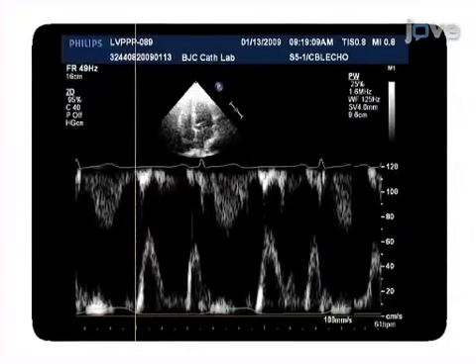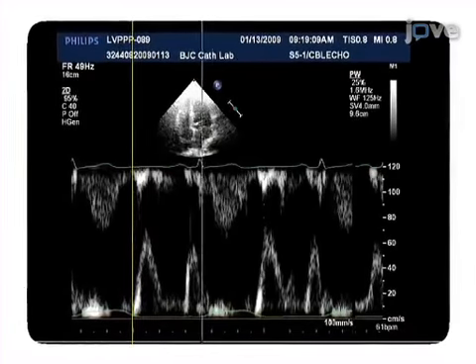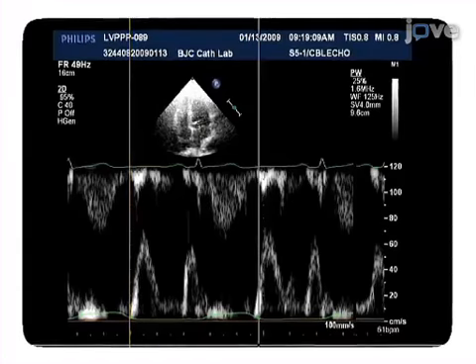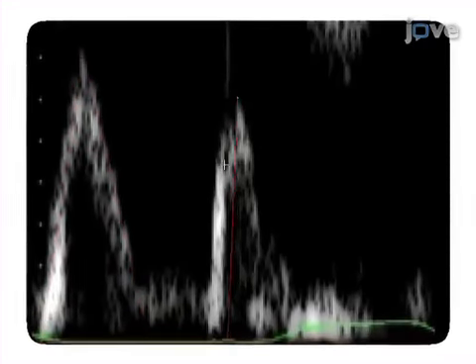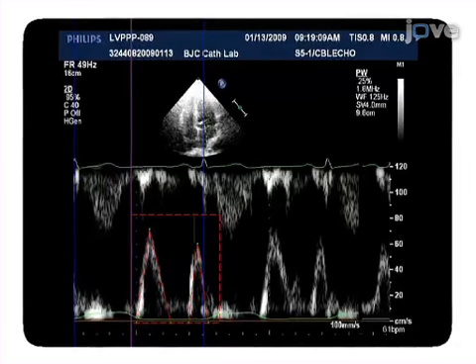The second step is to work with the transmitral flow images and focus on one heartbeat. A custom program extracts conventional diastolic function parameters for the E and A waves and pre-processes the image for the next step in analysis.